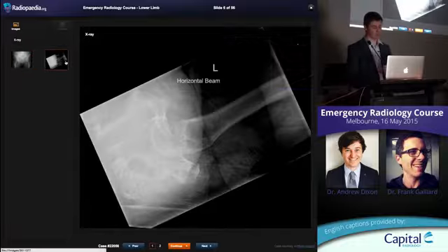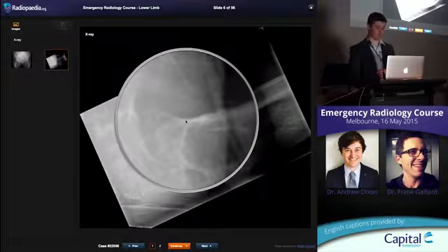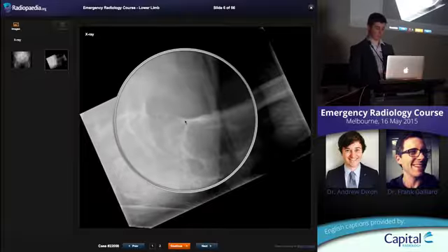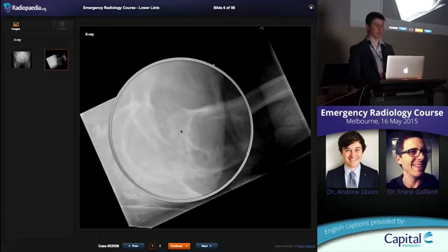If you look on the lateral view, it can be pretty subtle, nice curve here at the front, following it along, probably a little step, and the femoral head is just a little bit, see how the neck is here? The whole head is just a little bit posteriorly located compared to where you'd like it, but quite subtle.